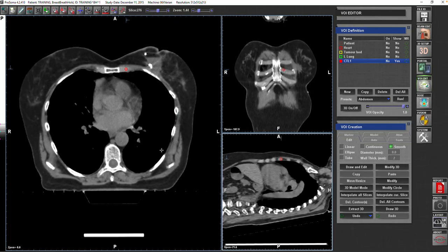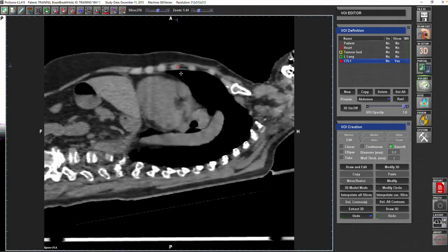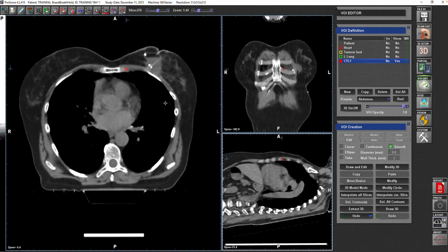And what is the importance of the fourth rib? It says that we end our internal mammary chain lymph node just above the fourth rib. Clearly, this will not be the case if you have an internal mammary lymph node sitting around the fourth rib. So you need to take a margin, maybe another space or so. So these are the landmarks that you need to know.